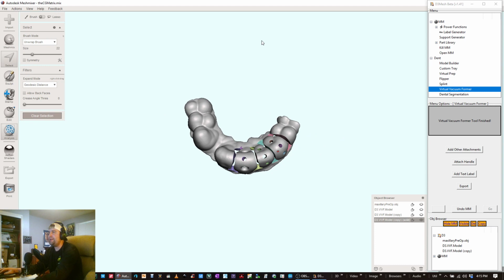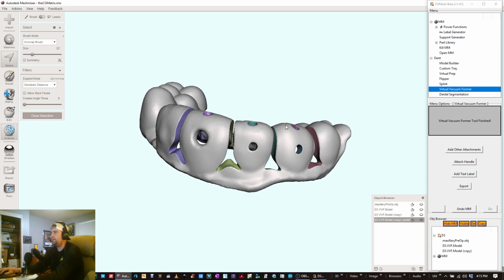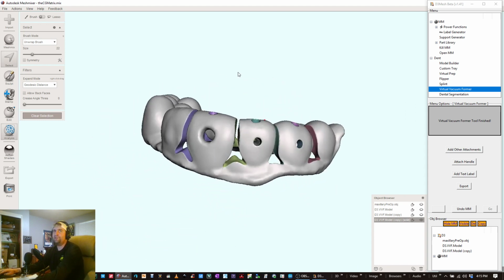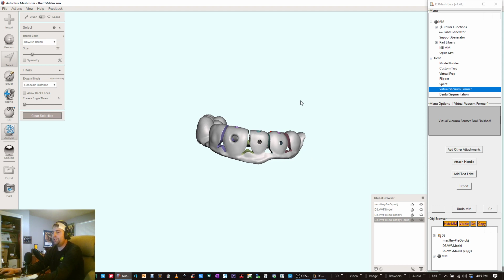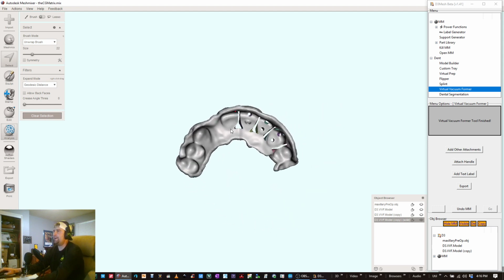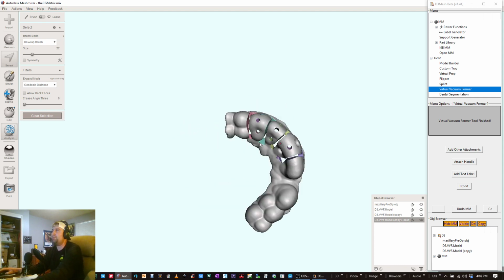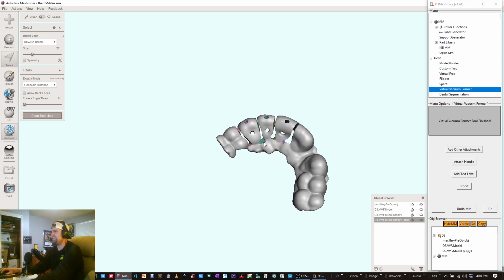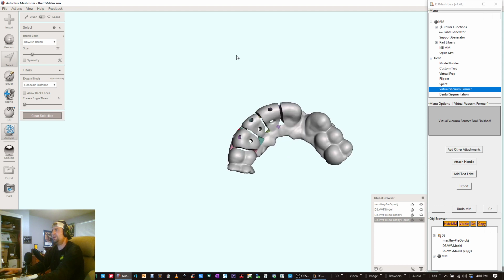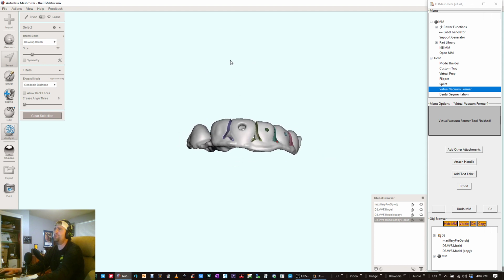The CG matrix, a tribute to Cory Glenn and his incredible, innovative thinking. And this is just a conversion to the virtual digital world, and it prints, and I haven't tried this clinically yet. But again, I'm kind of looking at this printed, and I know it's gonna work. It's better than a vacuum form Essex. It's got more accuracy, and all these little slices are just very accurate, and they have the nice kind of profile extending from them.